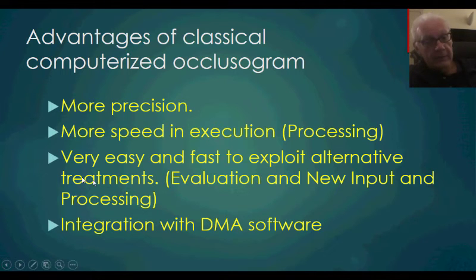And another thing which is very interesting is the integration with the DMA software, the software that we now use and that has taken the place of what we were calling before the orthodontic calculators, and this is also very important in designing the mechanics.